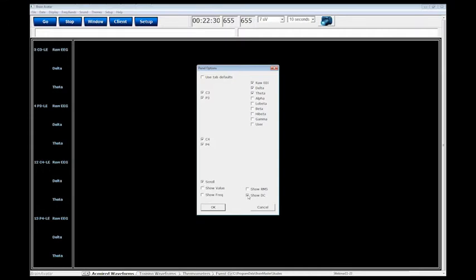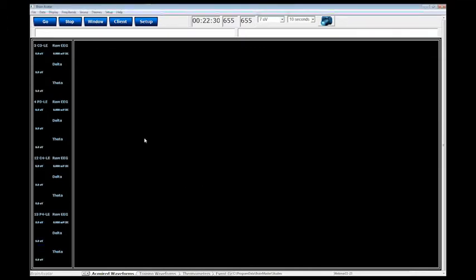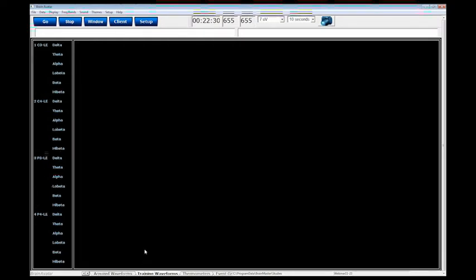And you can choose to show your DC offsets as well as the root mean square data. So this is, for example, on the Acquisition waveforms, some extra features that you can do on it. The next tab I'm going to show you is one that I set up called the Training Waveforms. Now this is probably something that you're used to if you've used the Discovery software before.